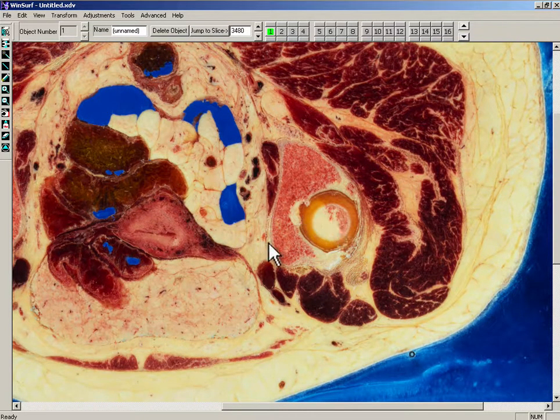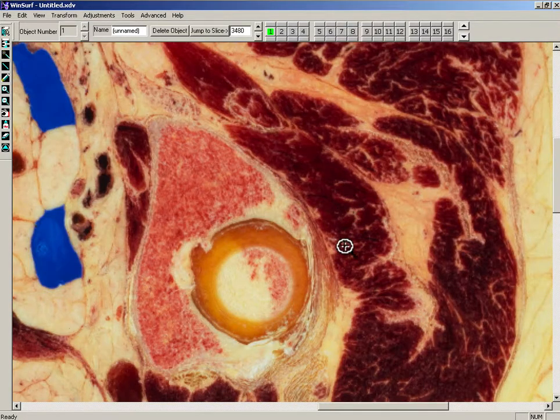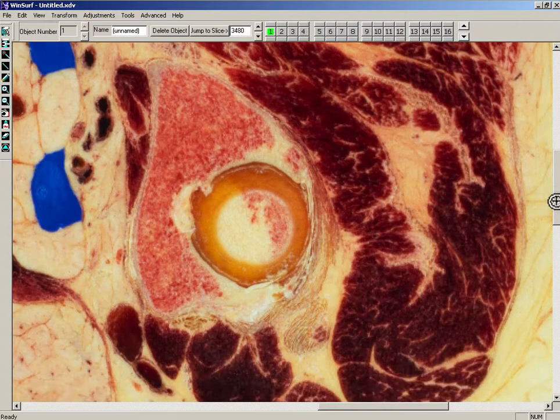We see that next. So you say OK, and you are here on the slice, and you center the screen on the head of the femur. You see on the left of the screen, you can see the different buttons. You can zoom on the head of the femur. You can unzoom. You can use different functions. One main function is the pen, and the pen will be used to outline the bone, the cortical bone.